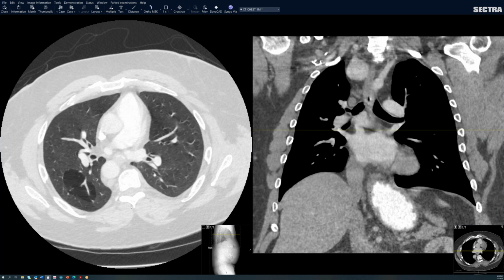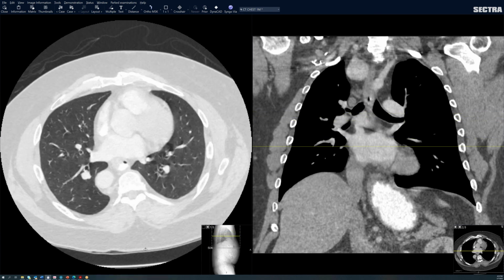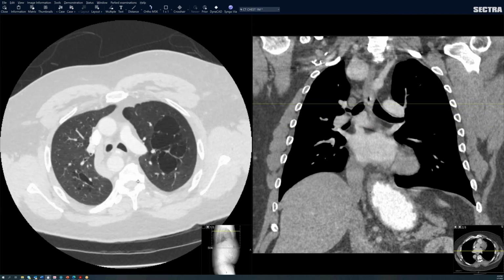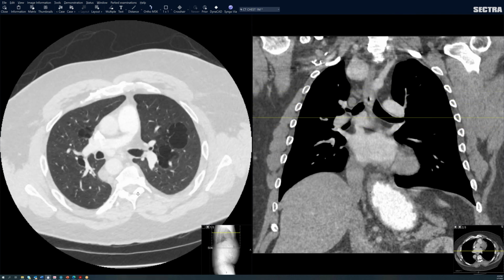I just can't tell. I see what you're saying. So you're thinking a bronchial atresia type. Yeah, something like that. Well, it's definitely not bronchial atresia because there is... Yeah. But like a sequestration, I know it's not the right spot, but sometimes you get those, and it doesn't have any kind of aberrant supply, so it doesn't fit with that.